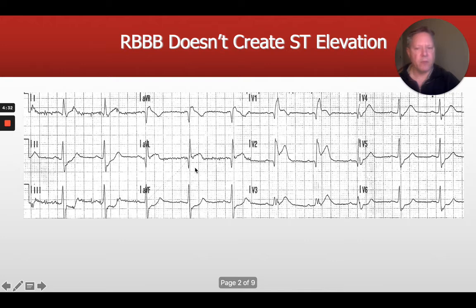So remember that 12 lead interpretation of acute coronary syndromes is a very dynamic process, and you may not get the whole picture right away, and that's why multiple 12 leads as you have the patient might be helpful to understand what's progressing or what's regressing. But for sure, we can call out a STEMI right there in the septal lead. So that'd be a septal MI with a right bundle branch block.